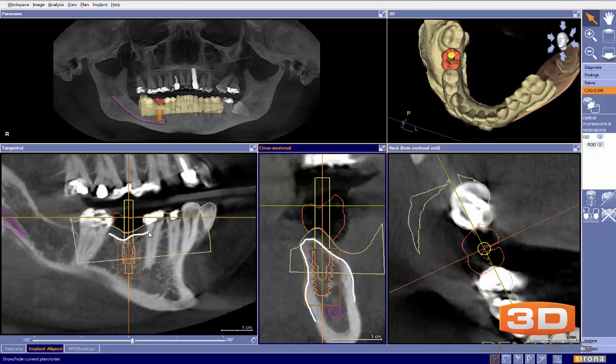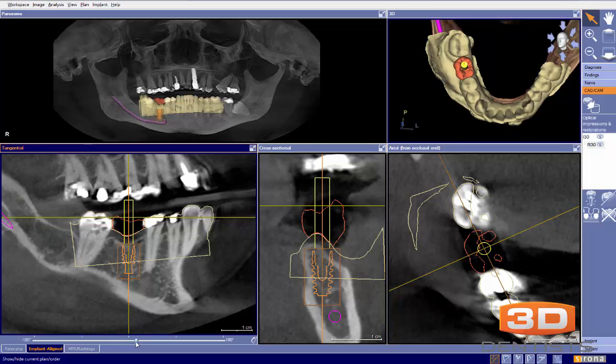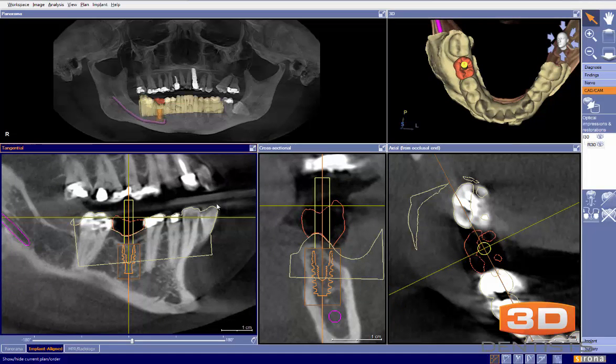we can see the bone level, and now what we have to look at, one of the things I look at in this case is how is my emergence going to look, like so, and then how much bone am I going to have to remove to allow this emergence, and how is that going to affect the interproximal bone on the adjacent teeth. So in this particular case, my preference would be to take my implant and put it in a little bit more ideal vertical placement. And then the only other thing, everything else looks pretty good. Our occlusal plane is pretty nice.